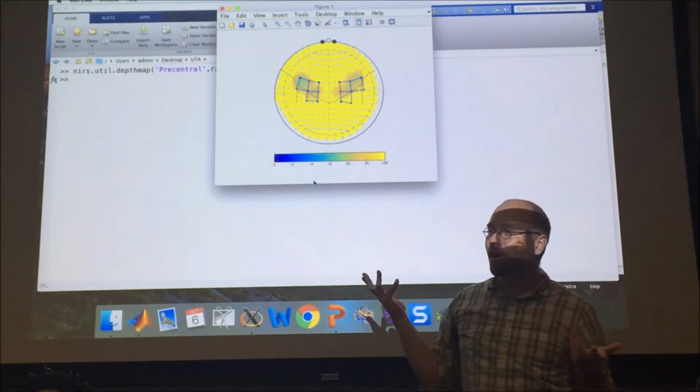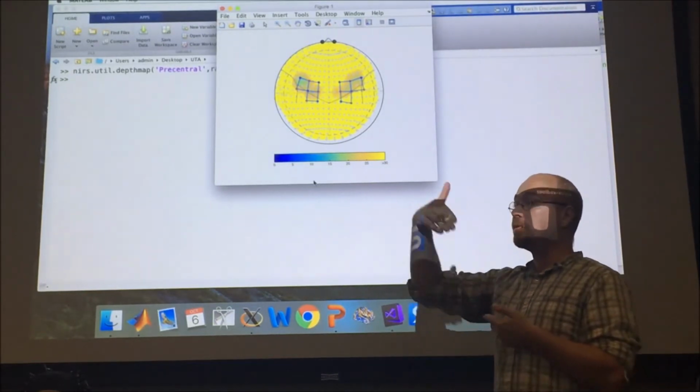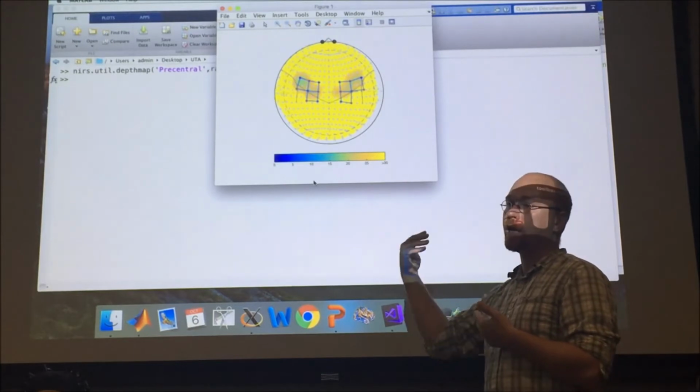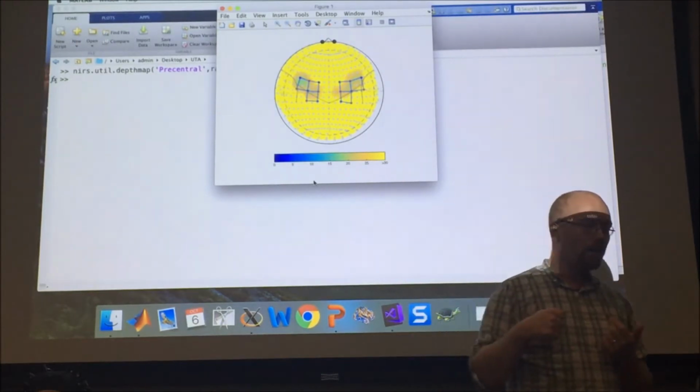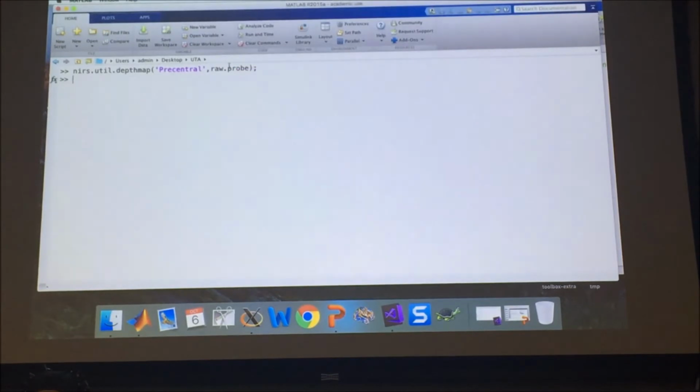Yeah, so this is approximate. If I actually had Thomas's anatomy, we do have advanced ways to put his anatomy into this, though I don't have the labels quite as nice on his brain. We use FreeSurfer. FreeSurfer will label some of these regions like precentral gyrus and stuff, and so I can derive that from individual anatomy. We can also, let's see.